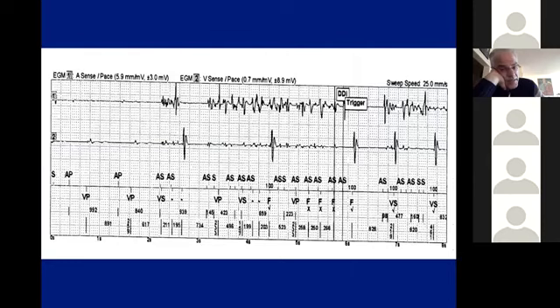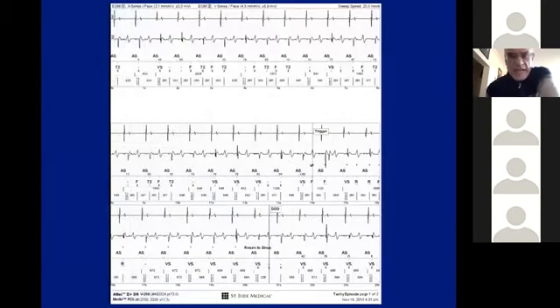No volunteers? EMI? Yes, that's probably it. And why do we think about that? Because you see it on both channels, right? If you saw it on one lead, you're more likely to have something wrong with the lead. If it's on both leads, then the chance that both leads failed simultaneously is probably less. So that's correct.